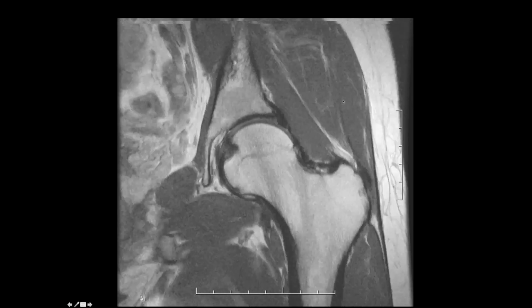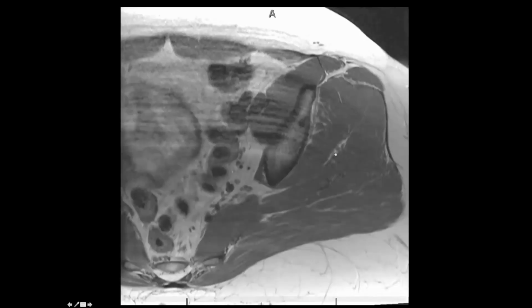Now, at the level of the lateral facet, we also see portions of the iliotibial band, and deep to the iliotibial band and overlying that posterior facet and the lateral facet will be the site of the true greater trochanteric bursa, also known as just the trochanteric bursa. On this coronal image, we see the gluteus minimus muscle, gluteus medius muscle, and gluteus maximus muscle. On our axial images, the more anterior muscle will be the gluteus minimus, followed by the gluteus medius and the gluteus maximus.